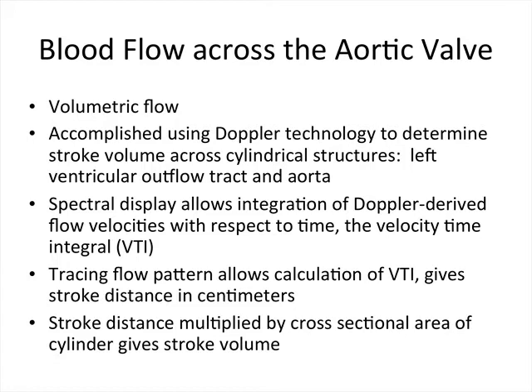The spectral display that is generated allows integration of Doppler-derived flow velocities with respect to time, which is known as the velocity time integral, or VTI. Tracing of this flow pattern allows calculation of the VTI. This gives a stroke distance in centimeters, so this is the distance that the column of blood flows in one cardiac cycle. Then stroke distance is multiplied by the cross-sectional area of the cylinder or left ventricular outflow tract to give stroke volume.